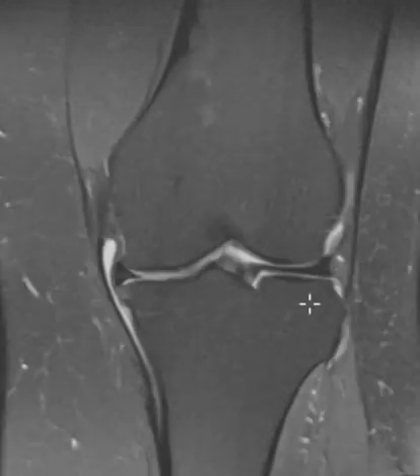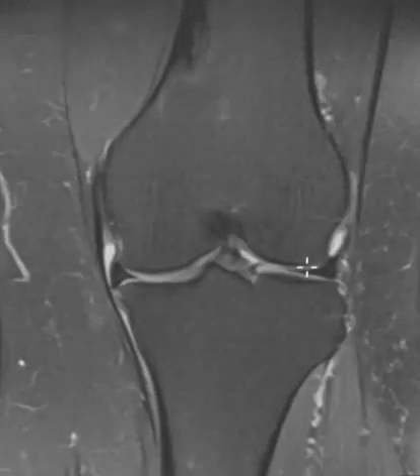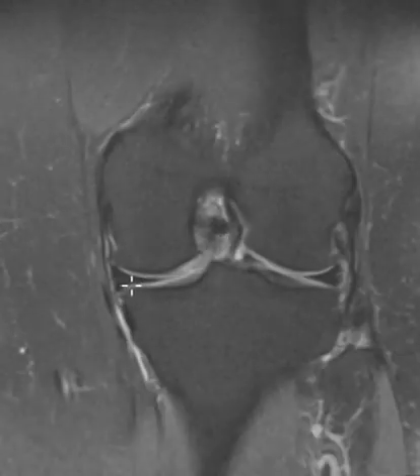And on this view here, we see something along the medial knee joint. This is the lateral side over here. We see the little black wedge, the lateral meniscus. Everything looks good over here, but on the medial side, there's something abnormal, which is right here. This vertical band of brightness is a fluid collection, and it's over the capsular surface, the outside of the medial meniscus. The meniscus looks pristine.